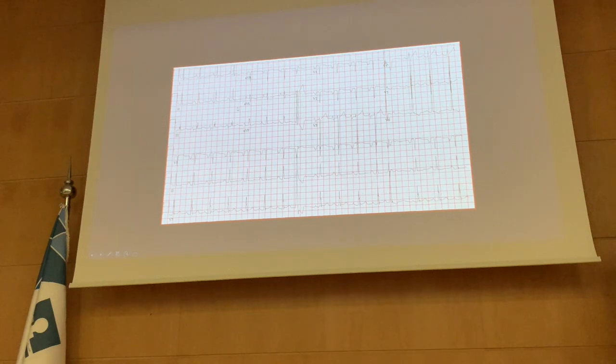Can you answer this? Yes. So this patient has multiple valve disease. He has mitral stenosis and tricuspid stenosis. And this ECG is done. So we're going to see this P wave here and a P wave here. Right atrial enlargement, okay, excellent.